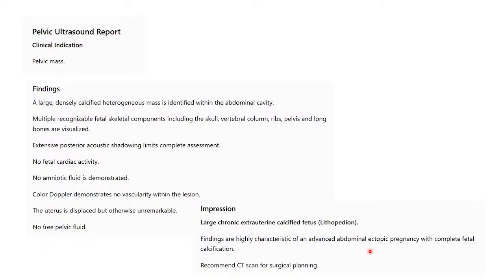It was not necessary because we have got all the information. So you know, when you are practicing radiology, you must also appreciate the role of other imaging modalities, and you must know to what extent some modalities might not be necessary. In this case, we have made a diagnosis already, so it's not necessary to cause unnecessary expense to the patient.